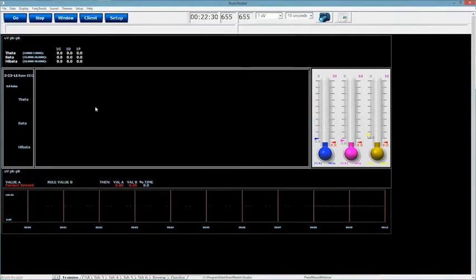Okay, so now that I'm back on my resolution right here, what I want to cover more now is we got the basic premise behind Panel Wizard. Now I want to go through the panel menus. This is a really cool feature and is really not used that often. This allows you to basically look at more information on every type of display that's out there.